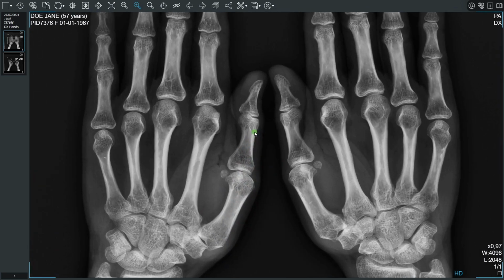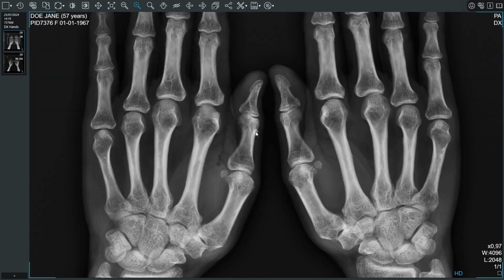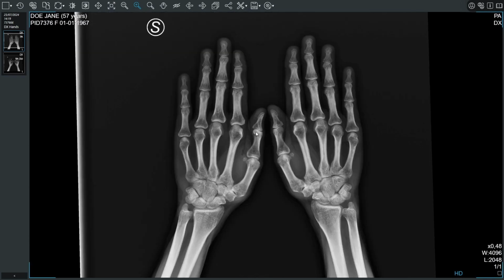To change the image's size to a fixed zoom level factor of 2, use the configured key bindings set to the up and down arrow keys by default. Press the Zoom 1x button in the toolbar to display the image at its original size.